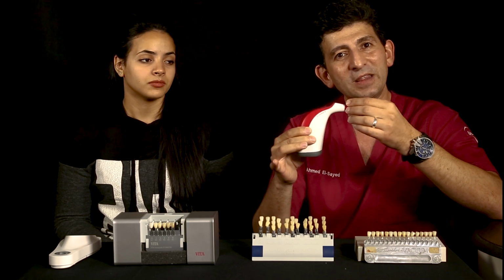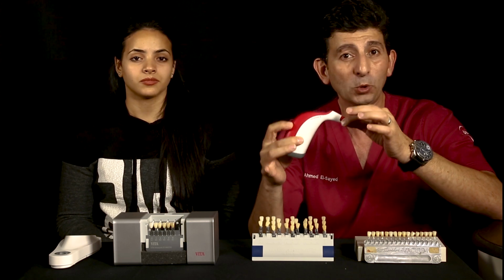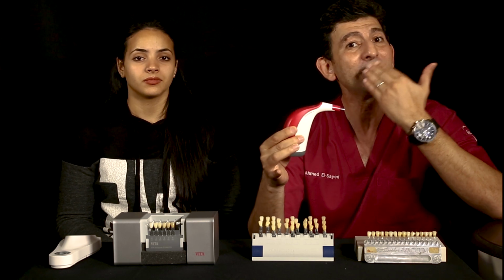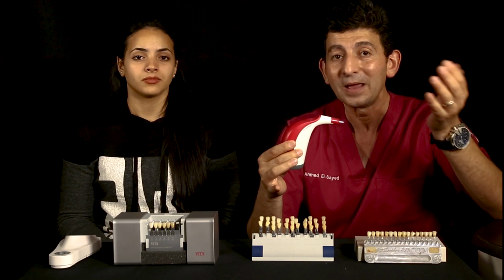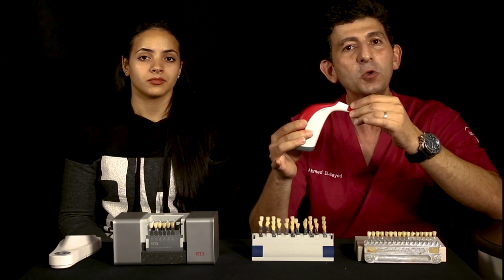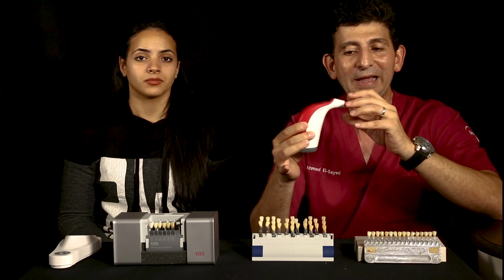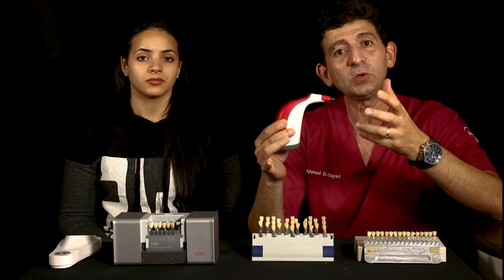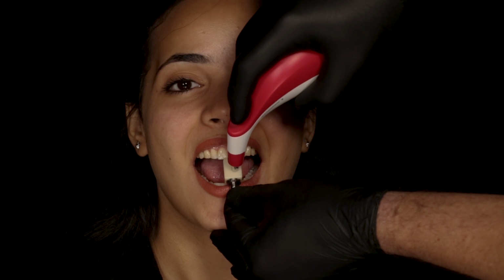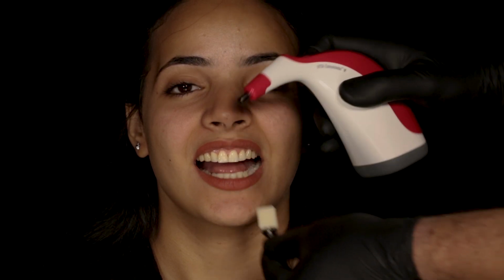Still, we prefer the spectrophotometer with porcelain, with ceramics, rather than with composite. As you know, the enamel in nature has no color, but light can move through the enamel and pick up the dentine color, so you have the main color. It's even advantageous if you use ceramic blocks or CAD-CAM blocks, because you can put it on the central and see what the color is on the screen, and then you can put it on the block and see what the color is on the screen.